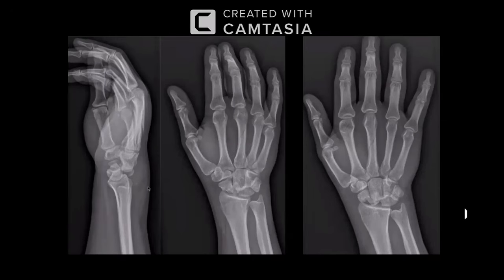Okay, very good. So let me just take over and I'll explain to the other candidates also. Yes, very good observation. You can actually look at first, as she described, there is a fracture line involving the third metacarpal bone, and on a lateral view, you can see there is some mild displacement and soft tissue edema is there.